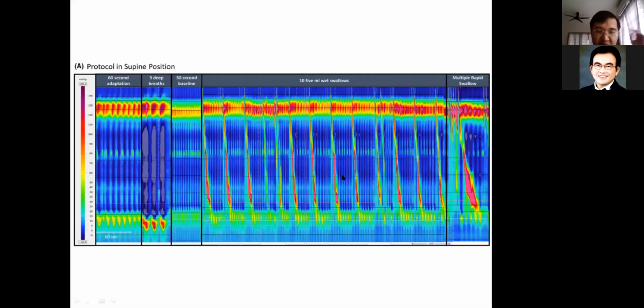So that will assist in basically confirming the position, that the catheter has passed through the LES. The intrathoracic pressure during deep breath will be a bit negative, so it's a bit dark, right? And you can see that the intra-abdominal pressure will be elevated during the deep inspiration.